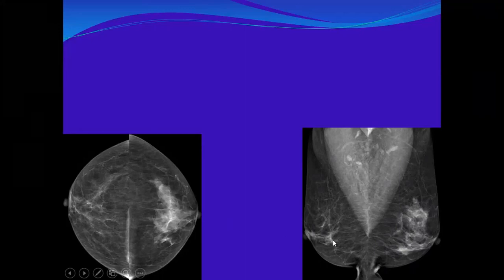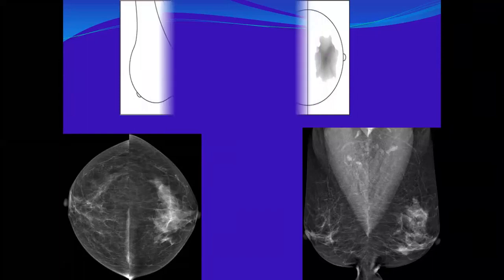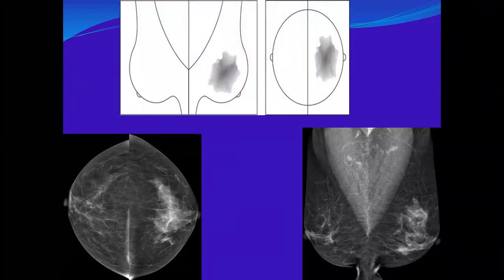breast, having no mirror image in the contralateral breast. Most importantly, it is not associated with a mass, not associated with architectural distortion, not associated with skin thickening, and not associated with breast or skin edema. And there is no axillary lymph node enlargement. So it is just a global asymmetry, and in this case, most likely just a normal variation. This is a normal variant, yes.